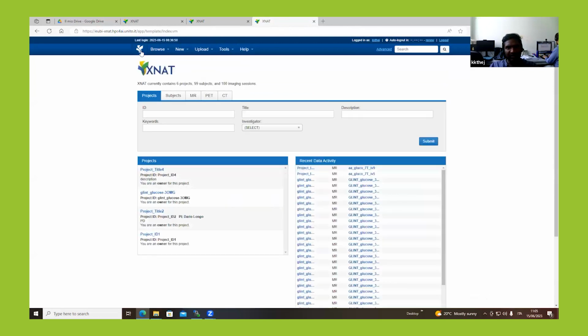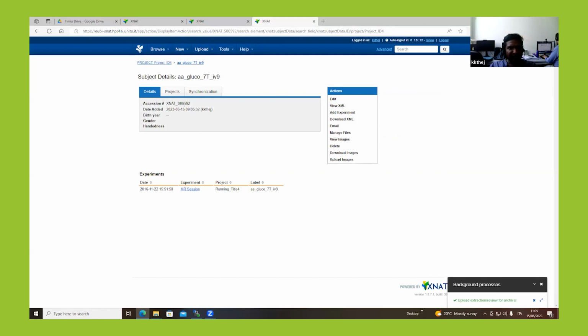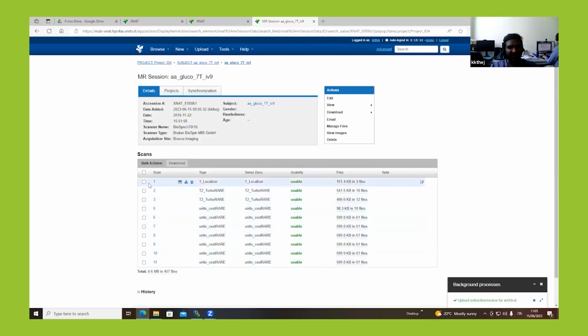I can just go back to the home page, and I can go to the project title 4 that I just created. This is the subject that is added, and if you see, it's an MR session. So if I click on my MR session, you have a list of scans that we did on this particular subject.